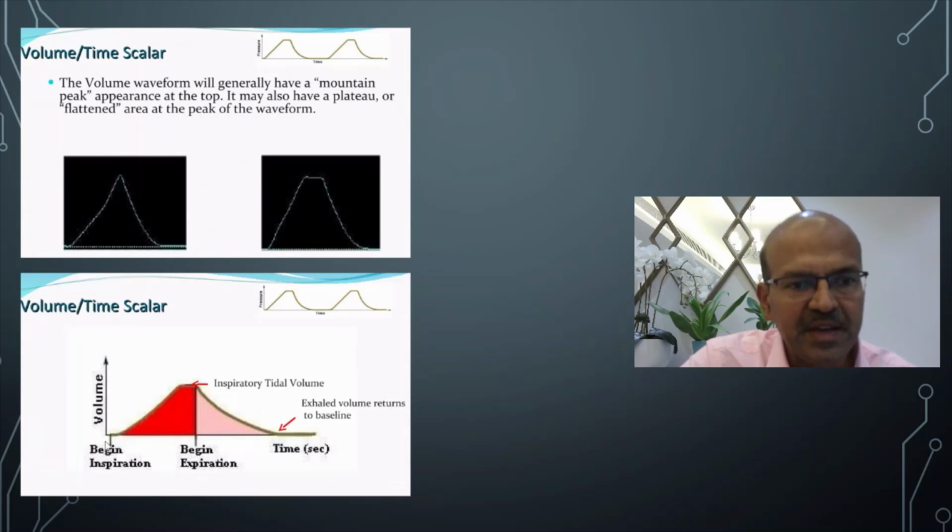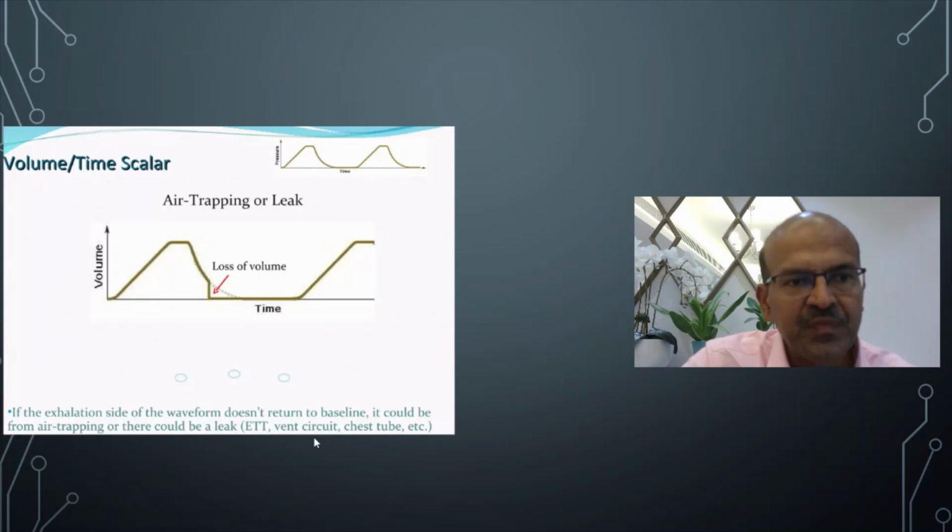And so this is the beginning of inspiration. The tidal volume is reached here, and when exhalation begins and reaches back to baseline. And the baseline is usually the FRC of the lung.